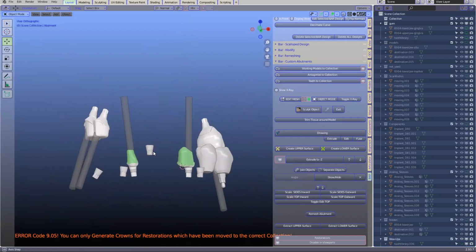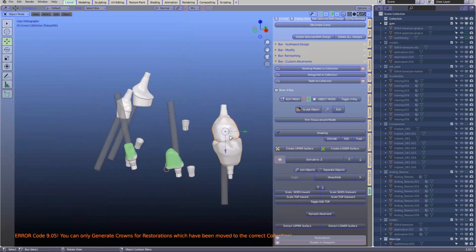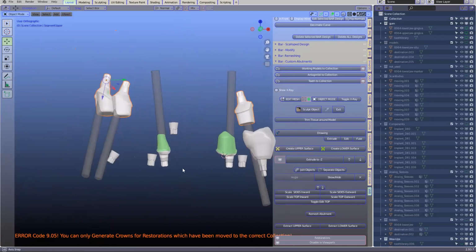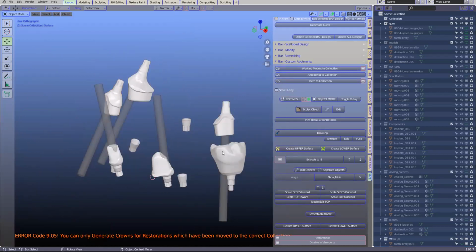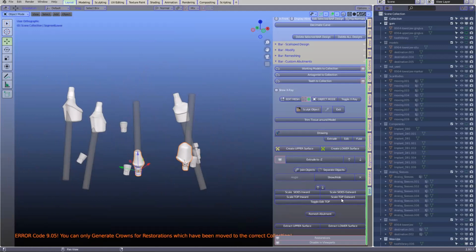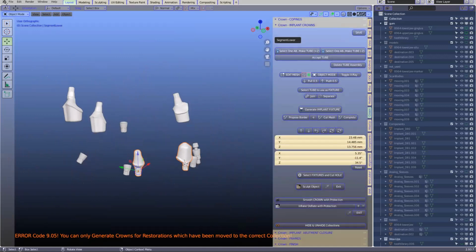Yeah, so here we go. This one we haven't done yet. Okay, don't worry. We've created the top. So here are quite a few custom abutments: 1, 2, 3, 4, and I think five. We've made 5 here. This one we haven't done yet. Excellent, that's looking good. I think you should save your work and then do another session just to finish the whole job. I think that would be quite good. I'll just save this.